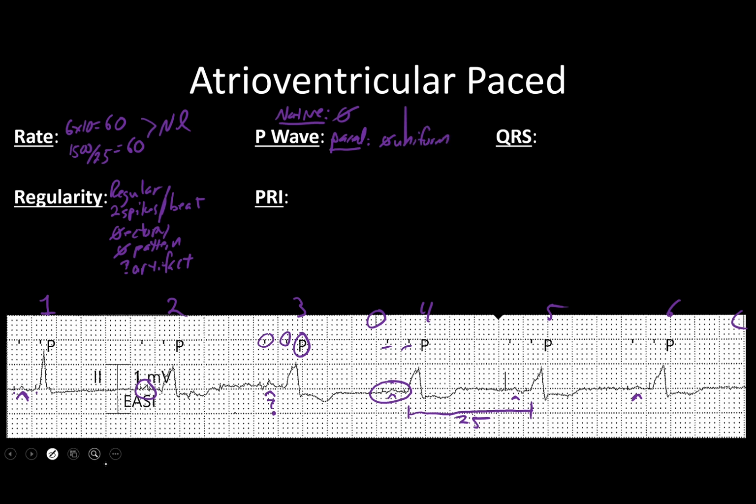And some of that may be due to the artifact that we're dealing with, and that's causing them to come across as being odd. Or the fact that the patient is being atrial paced. In real life, they often look like this, that you have a very difficult time seeing the P wave occur with atrial pacing. But ultimately, what we do know is that everything looks very, very consistent, and there is some kind of depolarization occurring. So that's enough to tell us that we do have capture, and that's what we want to see.